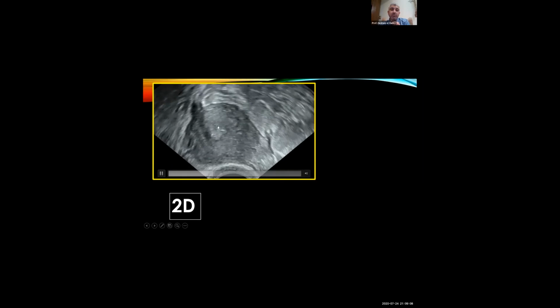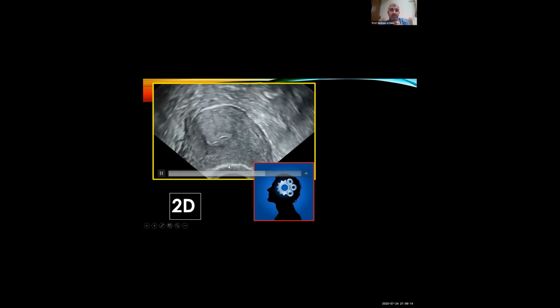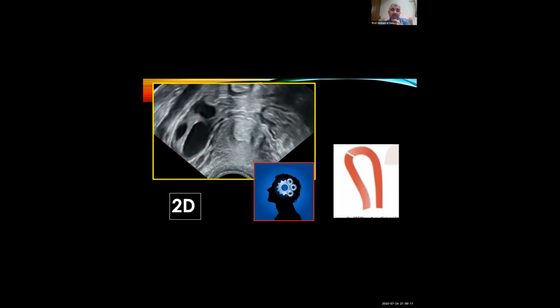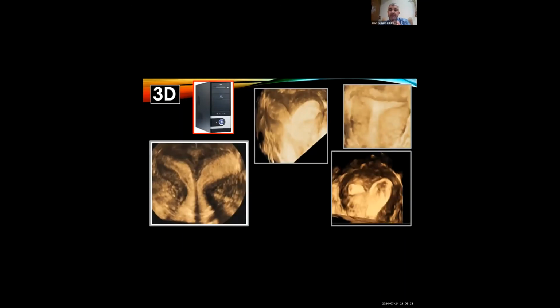And if you go up from the cervix to the cornual end, and you see that it tapers into one cornual end rather than into both cornual ends, and it's not getting wider up, then you would say that this is probably a unicornuate uterus. And of course, if you have a 3D machine with software and nice images, you could get very nice images about the shape of the cavity, whether it is a septate, bicornuate, or unicornuate uterus, unicornuate with a rudimentary horn, or a T-shaped cavity.